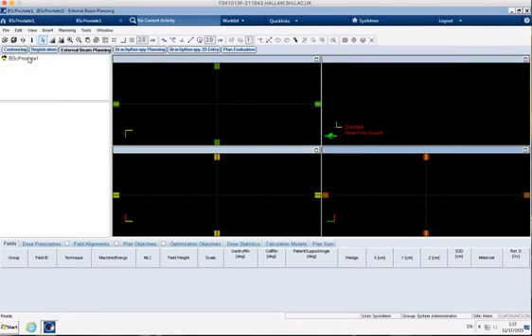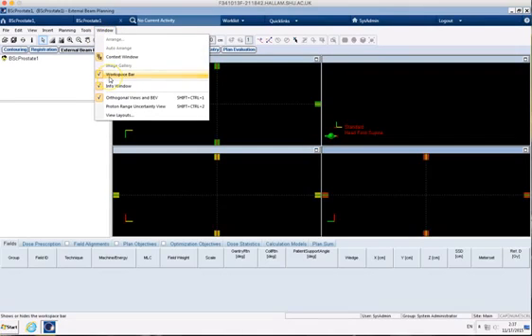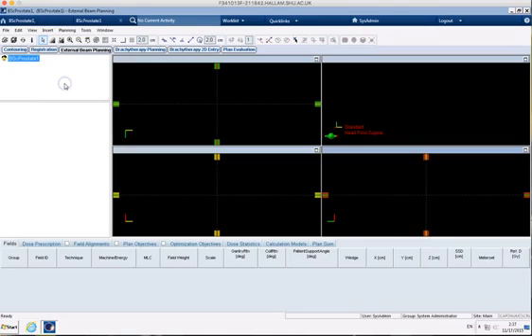So if your screen looks slightly different to this, if these tabs aren't here, this plan evaluation, brachy, external beam, then we need to add them because that makes life a little bit easier. So if you go to Window and tick Workspace bar if your Workspace bar isn't on.